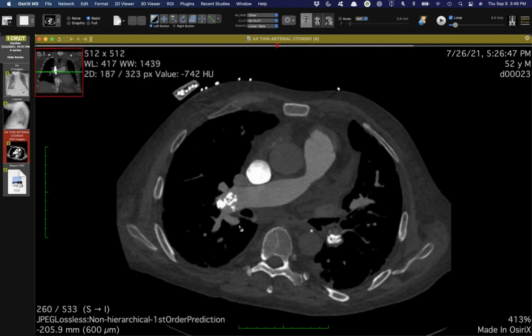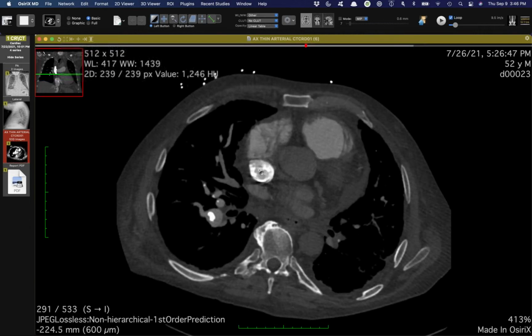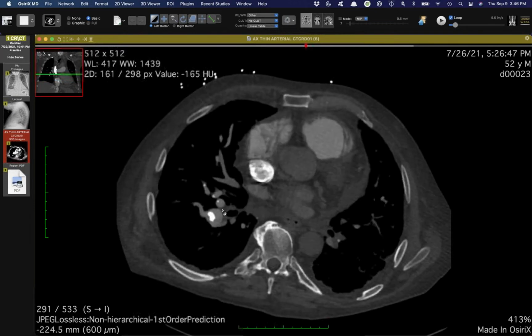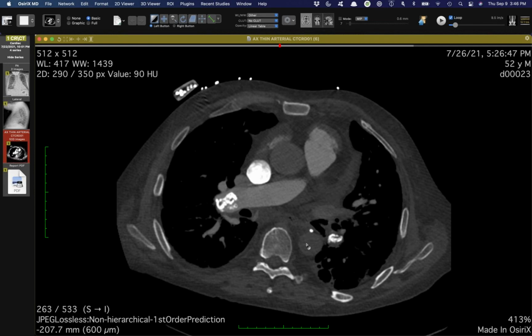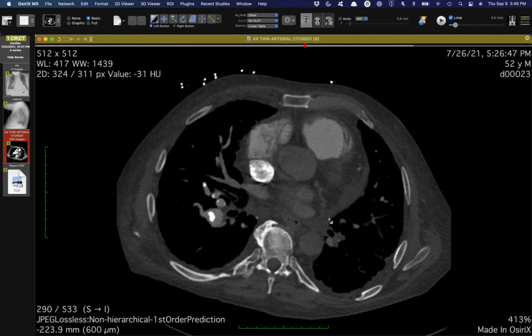Okay, and I suspect it probably did just embolize. It probably all started in the right atrium because this guy's had this indwelling ventriculoatrial catheter, and then maybe it flicked off, or maybe he just had separate calcified things or thrombi that then subsequently calcified. I don't know, but yeah, I agree. I think we just call this calcified thrombus, period. But that is an entity that gets floated around in the pathology literature.